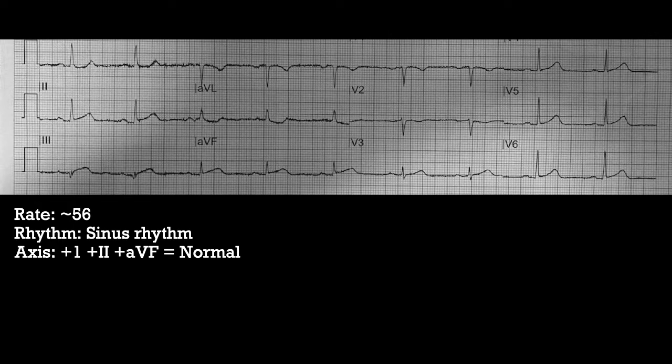And then broadly looking at the QT interval, again, look at one QRS segment versus another QRS segment, and does the T wave end before about halfway through, which would be right about where the center of that cursor is. And it looks like the T wave does end before that. So this is probably not a real long QT. Again, that's not a measurement. It's just an eyeball way.